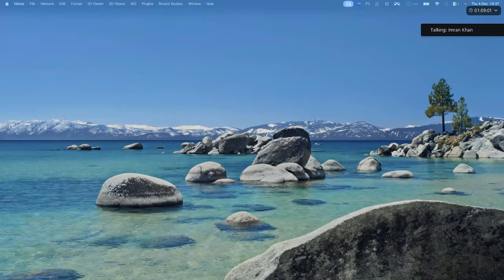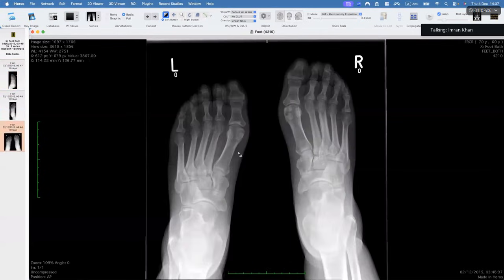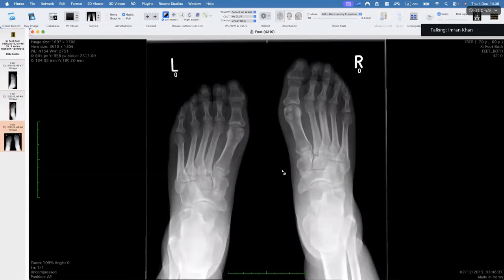And the last one actually is an interesting case because it shows not subchondral changes. These are erosions. Okay. These are actually erosions. And when you start seeing erosions with normal bone density in atypical joints, there are very few differentials that come to your mind. Okay. And then one of them would be gout. Okay. PVNS would be one differential where you can see erosive changes, and in the late stages you see loss of joint space, but to get bilateral PVNS would be kind of unusual. So this is actually a case of gout.